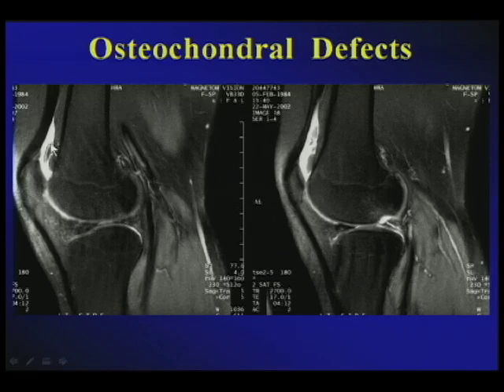You notice that there is at least a bilaminar nature of this loose body. Here you notice the hyaline cartilage itself, and then underneath it the subchondral plate. This is the slice selection to be exactly over this loose body in the suprapatellar recess. Let's go to another slice selection using the same fluid-sensitive sequence, and here, confirming what we saw in the radiograph, is this large divot on the lateral femoral condyle.